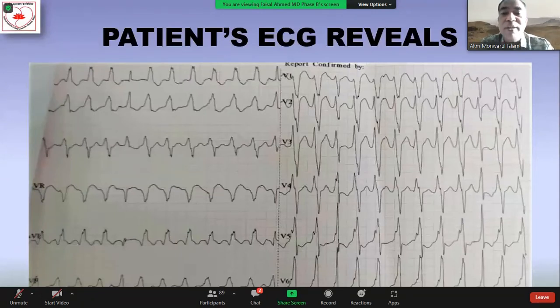So this is a normal looking sinus beat with a P wave in the runs of ventricular beats. This is a capture beat. And the fusion beat means a hybrid beat. Another term is chimeric beat. So this is nothing but a beat that has intermediate morphology between a ventricular beat of that ventricular tachycardia and a normal looking sinus beat. So it is an intermediate morphology beat that has been created by fusion of a sinus beat along with a ventricular beat. Thank you.